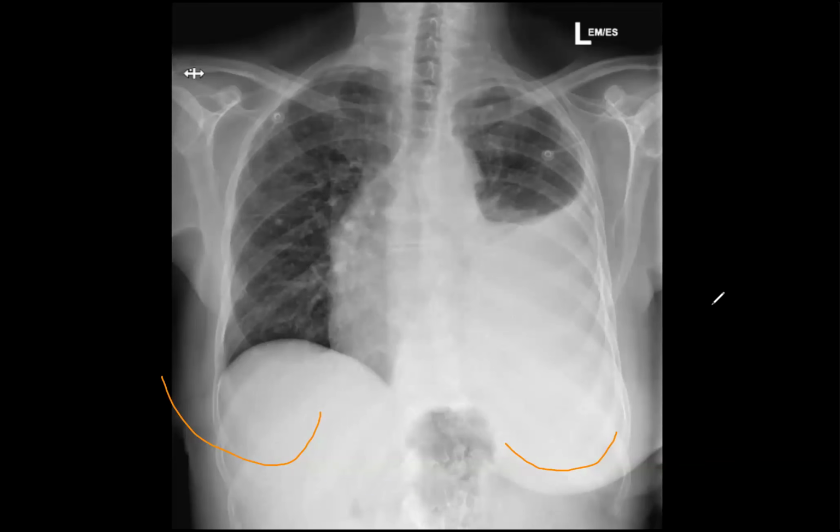Good. I'm not seeing any evidence of any metastatic nodular lung lesions in the visualized lungs. Maybe small nodules, subtle nodular opacities and some increased interstitial opacification also noted. So maybe possible lymphangitis carcinomatosa also. Fine suspected nodules. With history of cancer breast, this will be considered pulmonary nodules.